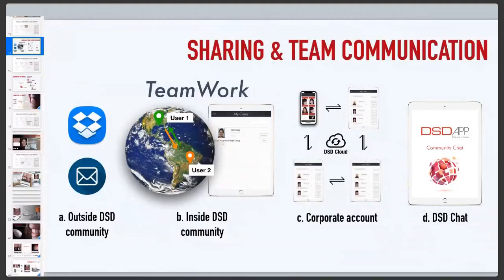And the same thing for the lab, right? So instead of sharing via email, needing to upload the files and look for things in different places, you can share the whole documentation straight with the lab, if your lab uses the app, or as a zip, for example. It depends on the case, on how it works best for you. But ideally, having the app, you can easily share and get the file back.